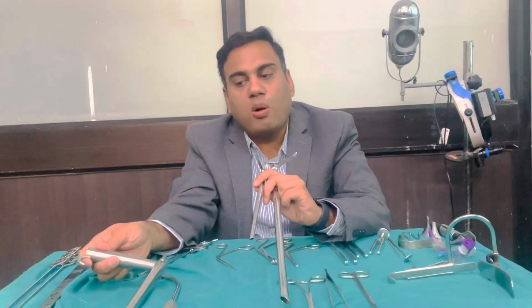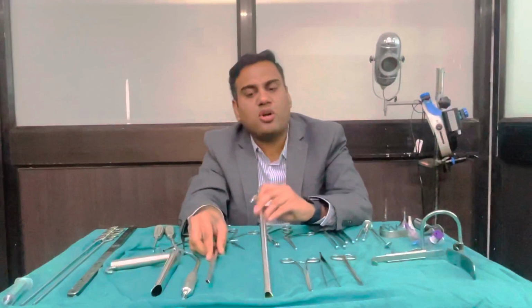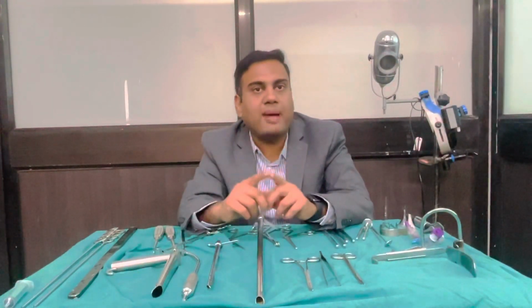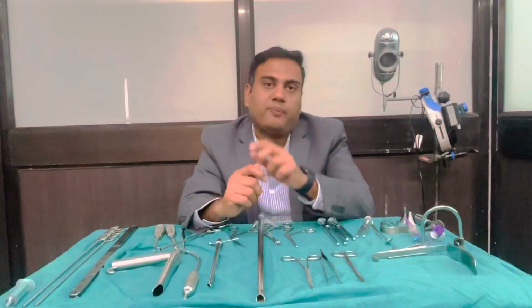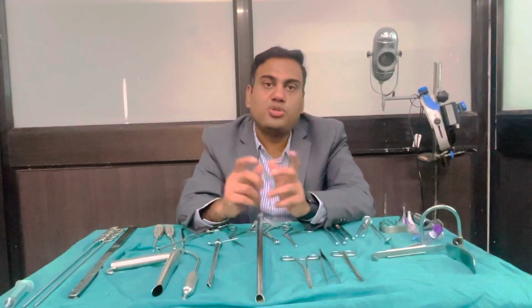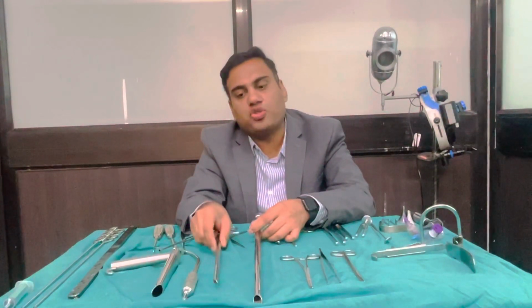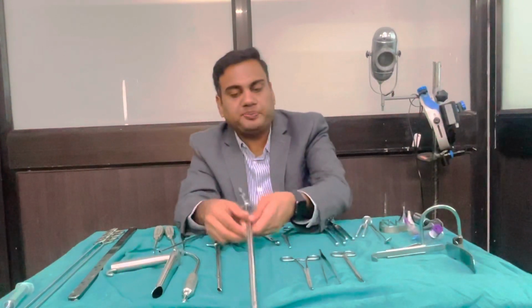So the common complications that you get from these scopies are, of course, trauma and hemorrhage to the esophagus or bronchus respectively, but also damage to the teeth, and bleeding from the upper central incisors or loosening of teeth. These are common complications that you will have with these instruments. So this is about the scopes.